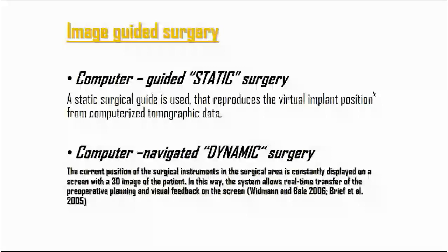One is to have stiff or static guides, which will direct in one position our implant drilling procedure, and also in past few months or past year, we could see that the power of the navigated or dynamic system of the surgery is growing, and that probably in the future we will need both of these systems, because we will have different anatomical situations needed to be handled.